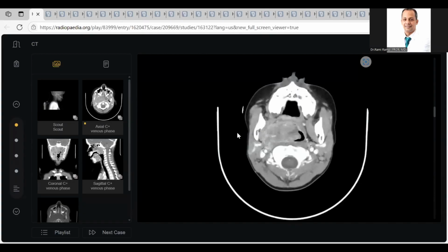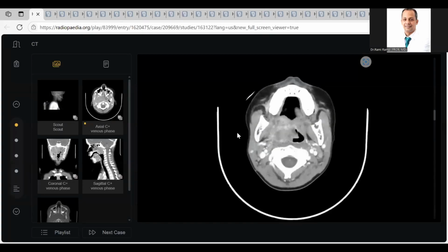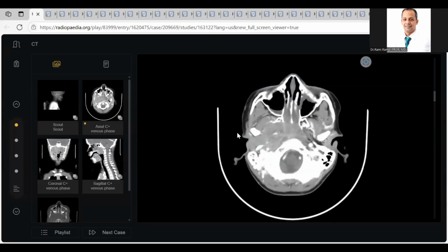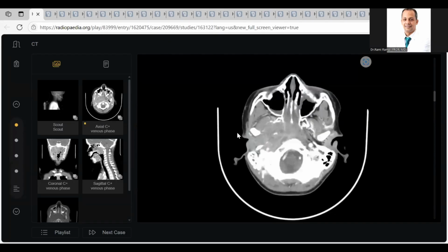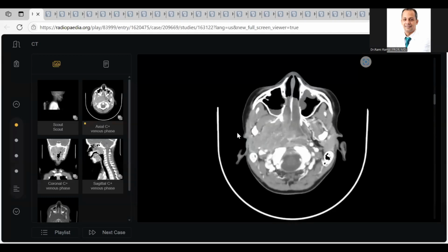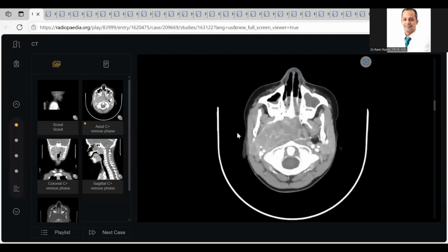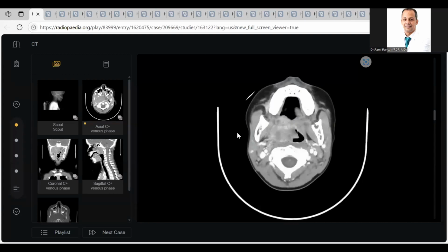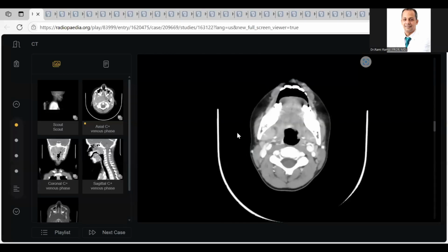In the nasopharynx, I am unable to see the fossa of Rosenmüller or the eustachian tube space, and it is causing marked obliteration of the nasopharynx. Superiorly and anteriorly, it is causing obstruction of the bilateral nasal cavities as well. Laterally, it is causing remodeling of the bilateral pterygoid bones, and there is contralateral spread into the parapharyngeal space, causing marked narrowing of the oropharynx as well.